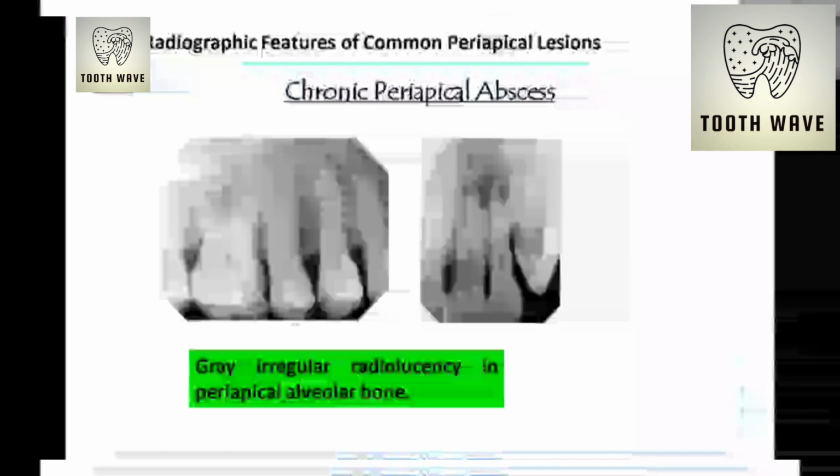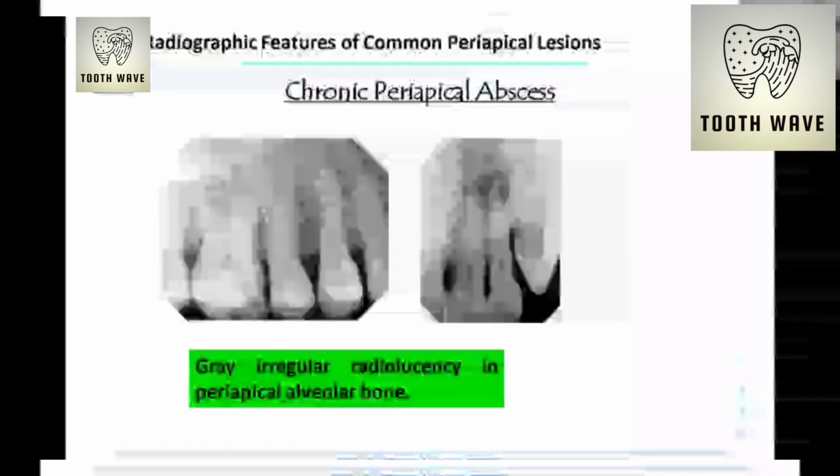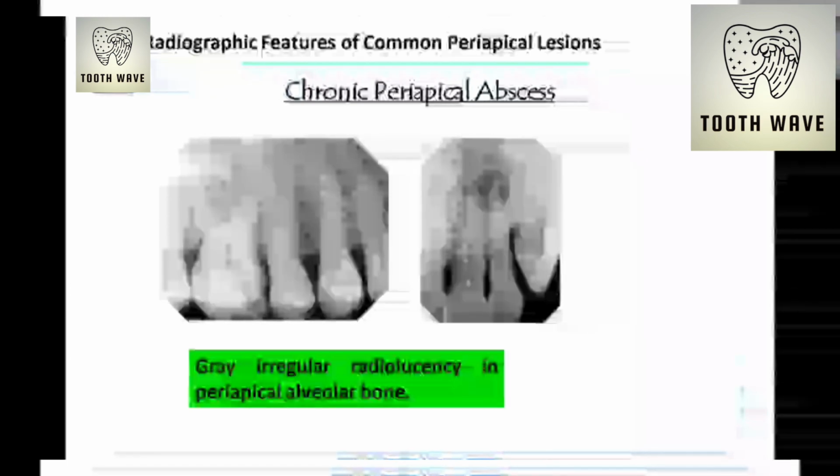Similarly, you can see all these teeth. This 1, 6 has a major proximal radiolucency in the crown involving the pulp. You can appreciate three roots, mesiobuccal, distobuccal, and the palatal roots, with widening, loss of lamina dura, and irregular radiolucency here.